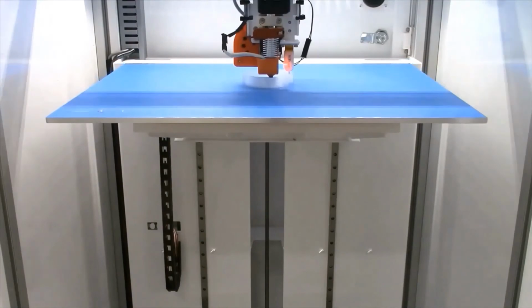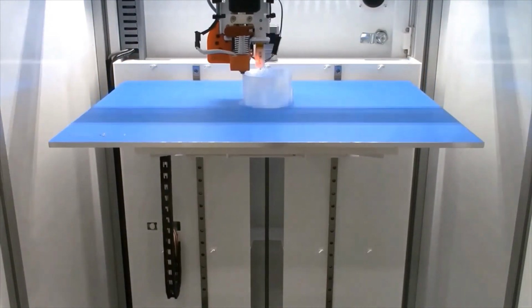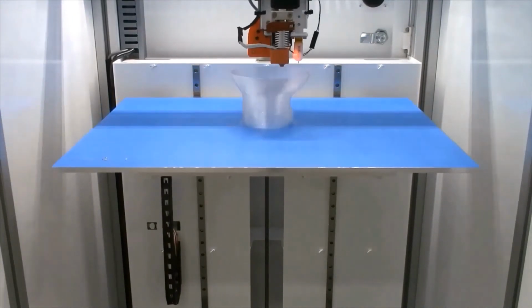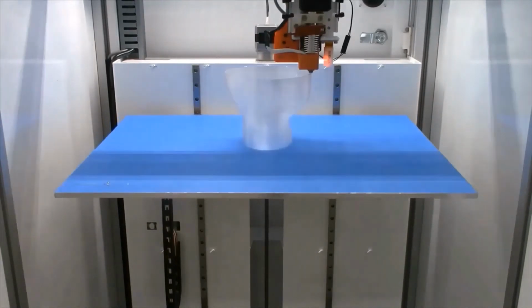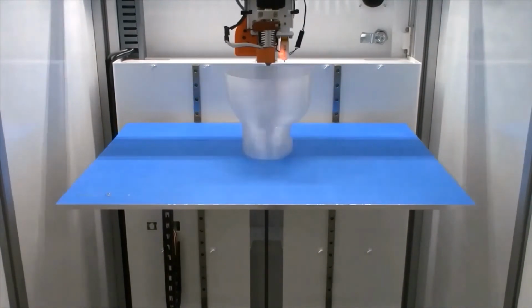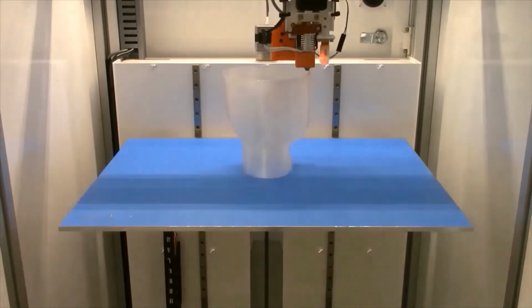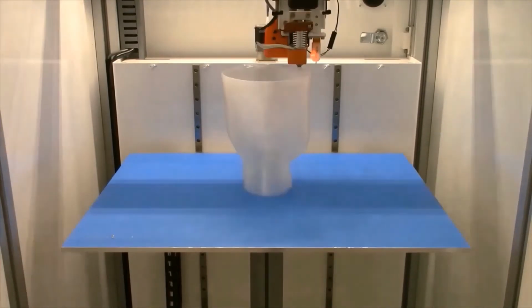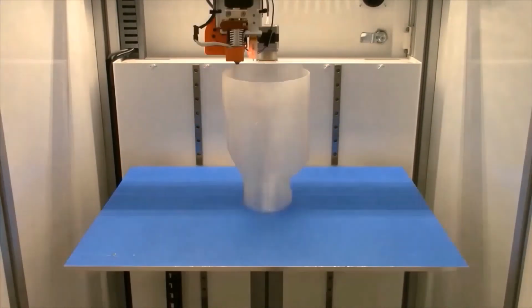After getting a good first layer or two, the printer can largely fabricate the device unattended. This is what makes additive manufacturing so scalable, in that one technician can manage many 3D printers printing check sockets simultaneously. This allows the process to be very scalable while not requiring additional incremental labor to produce many more devices.